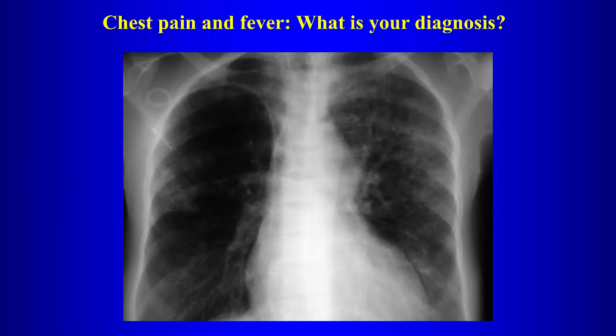What do you think of the bones? Oh, chest syndrome. H-shaped vertebrae. Yeah, you have these H-shaped vertebrae. So this patient has an underlying sickle cell disease, right?